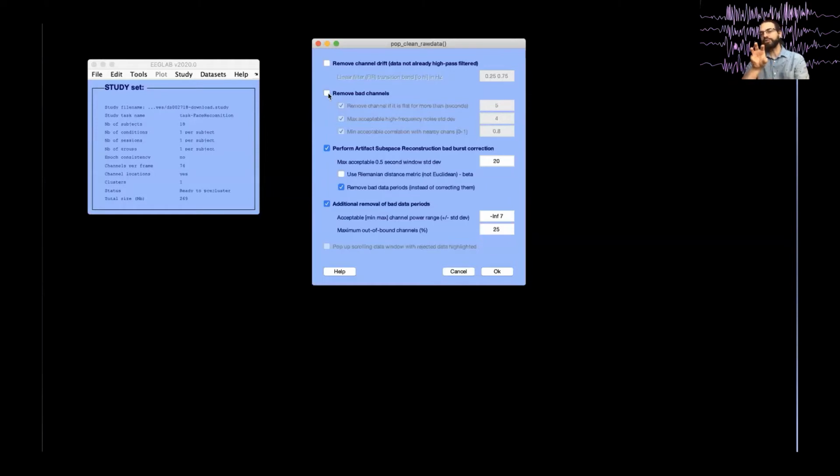So I'm just using the last 2 parts right now. The reason I did it this way, in this order, is that for this specific data set, there were lots of eye blinks. So if I was just checking all the options at the very beginning, it would remove tons of data with eye blinks. But ICA can correct the eye blinks, so I don't need to actually remove that data. So the way I do it is first I remove the channels, then I run ICA, remove the blinks and the muscle, and then remove the very bad portions of data before I process it further.